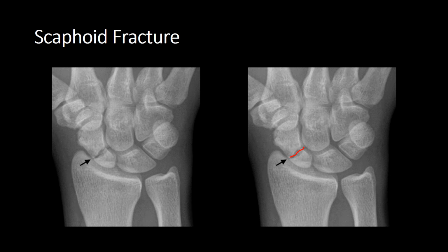Okay, here we have a scaphoid fracture, but before we concentrate on the fracture, let's have a quick look at the distal aspect of the radial cortex. You can see there's a little notch here, or lump I should say, and this lump is normal and sometimes can be misconstrued as a fracture, so it's important to recognise the normal appearances of this location.